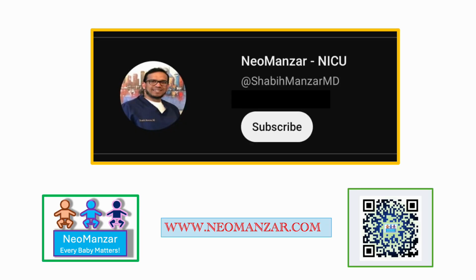So I hope you have learned something today. The basic idea is that whenever you get an X-ray, always look at the signs of anasarca in babies who are retaining fluid, have hyponatremia, have low urine output and need vasopressors. And of course, like we addressed, you have to look for other problems as well, like looking at the heart shadow and the lung expansion.